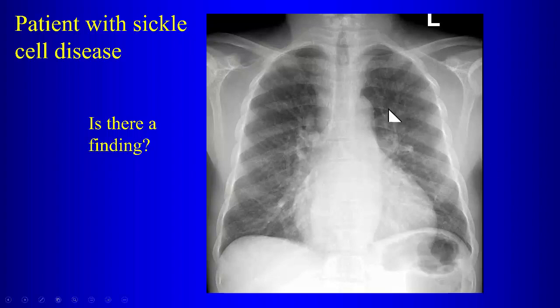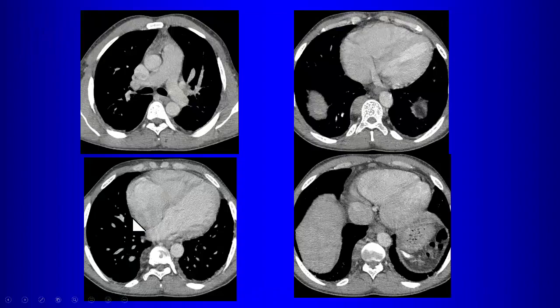Okay. So here on the left side, this is the aorta. What is this on the right side? Esophagus, dilated esophagus? Extramedullary. Is that filled with sickle cell? Extramedullary. So here's the CAT scan. So first, what are the findings associated with sickle cell in the CAT scan?